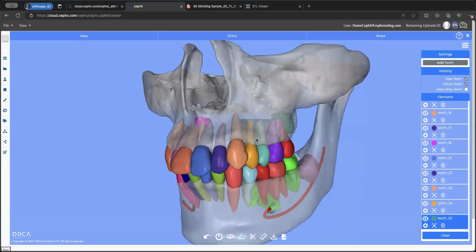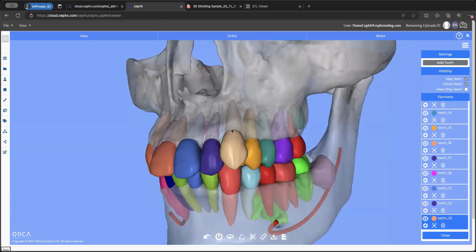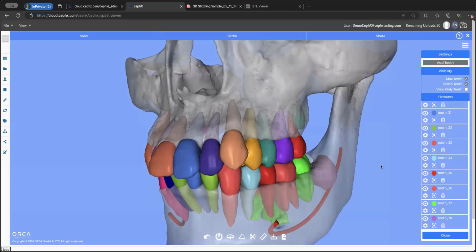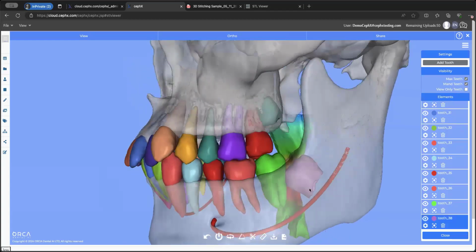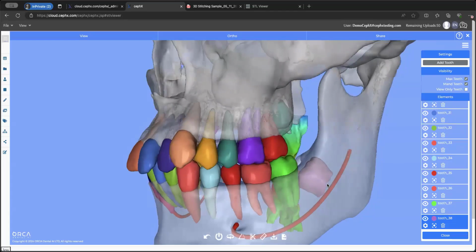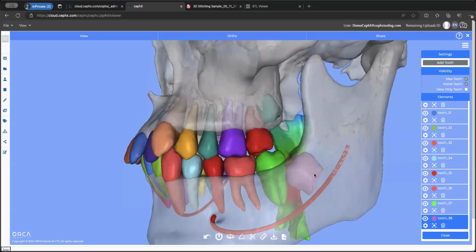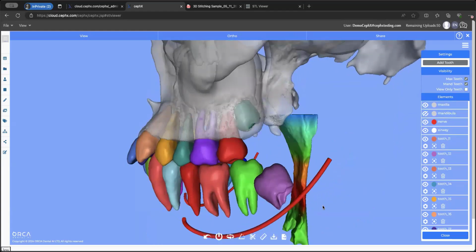So first of all, you can see this is a case with only the segmentation of the CBCT. So you can see that the crowns are less accurate naturally, because you only have the limit of accuracy according to CBCT. By the way, this is always a great view to see the interface between the nerve and the molars or premolars or wisdom and so on. There's a lot more cases where these interface than anybody would have expected. It's very obvious once you have this kind of viewer.